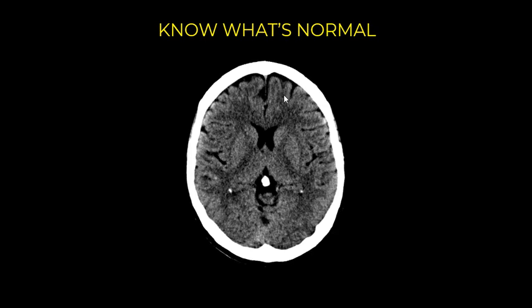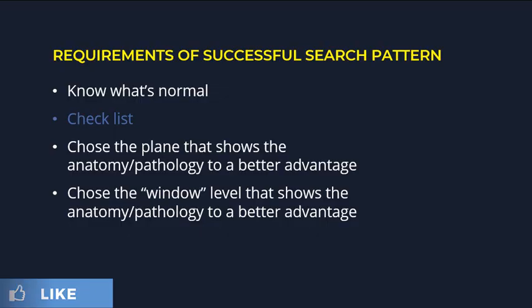The white matter, whether it's subcortical, periventricular, along the corpus callosum, or along the white matter tracts, is always darker. This difference between the density of the gray matter and white matter is what's known as gray-white matter differentiation, and this is the normal that we will be emphasizing for this lecture.